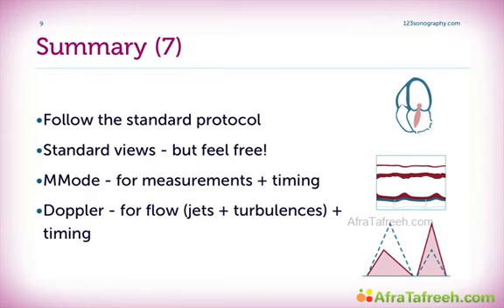Doppler allows you to measure velocities across the valve or even within the heart, and also timing of events, and color Doppler helps you to note where turbulences are, which then again might help you in assessing the velocity or the pathology there.